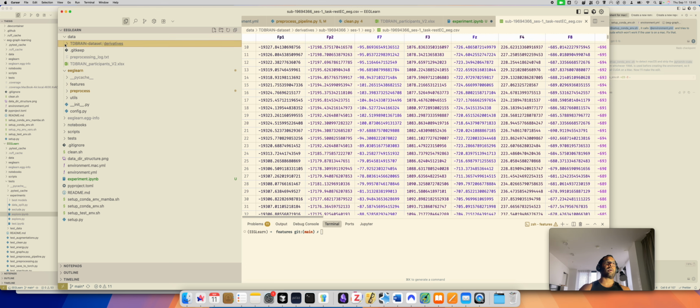And plots equals true. I'm just putting it true here to show you what you get. If you set plots equal to true, you get these plots of before and after the processing, and then before and after ICA and the prep cleaning steps. So if you are interested in that, you can put that. Of course, if you are cleaning all 1,200-ish files, generating these plots is quite useless and it's quite slow. So you can decide what you want to do there.